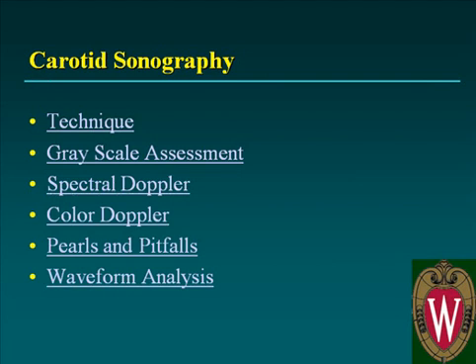So this is an introduction to basic carotid sonography. I talked a little bit about how the study is performed, how to assess plaque in grayscale, spectral Doppler analysis, color Doppler analysis, and then some pearls and pitfalls. In a separate lecture, I will talk about waveform analysis.